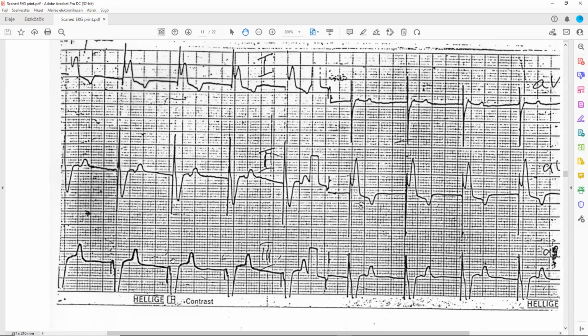Okay, well, the QRS complex represents the depolarization of the ventricles. If you do have a ventricular escape rhythm, it shouldn't start with a spike, with this rapid activation. So something is weird here.